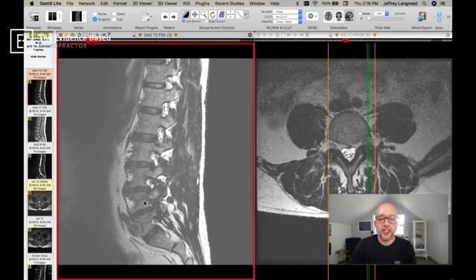So we know if, let's say, L4, L5 is compromised, that level, common level for many people, that tells us that it's very likely to be pain down into the calf. We know if L5, S1 is compromised, there could be pain all the way to the big toe. If it's L3, L4, it might be more on the front of the thighs. Of course, these overlap a little bit, but there are some clinical hallmarks of the pain that you may be experiencing and what level it may be correlative to in your spine. So you could hopefully clearly see this is a severely pinched canal compared to what you have as far as that big bright white space up above.